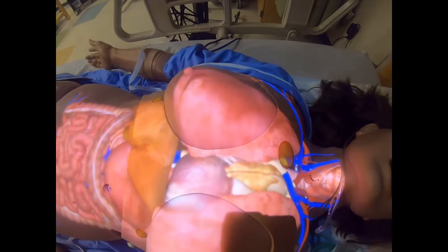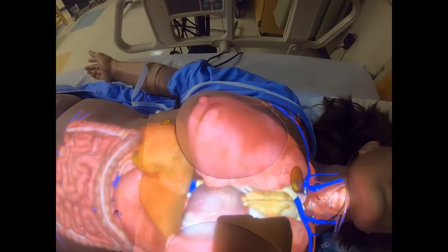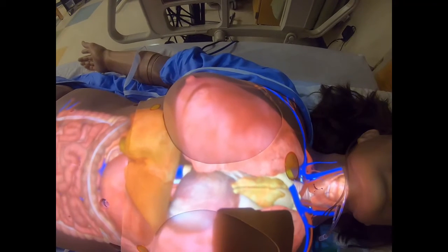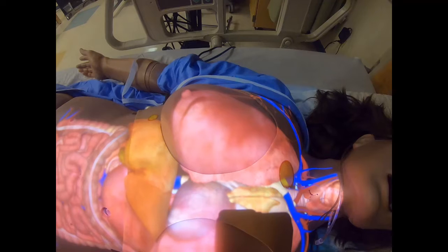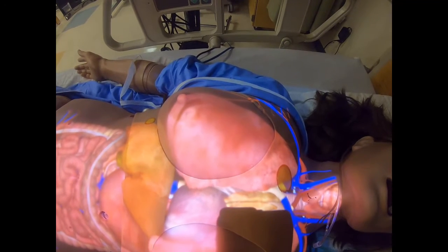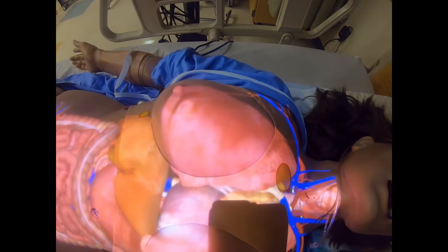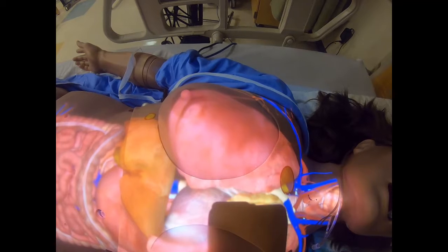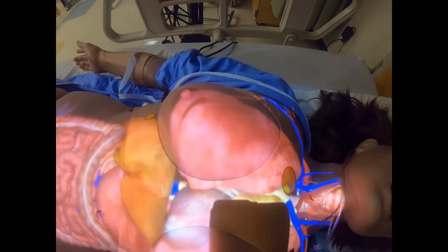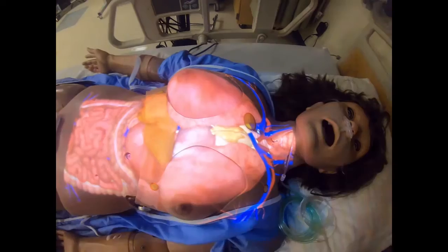As we talked about earlier with our patient with a pneumothorax and the pulse oximetry decreasing because of the inability to get a lot of oxygen into my lungs, what happens when I have a pneumothorax? The end-tidal CO2 goes up because my body is not able to get rid of it as efficiently as if both of my lungs were functioning properly.